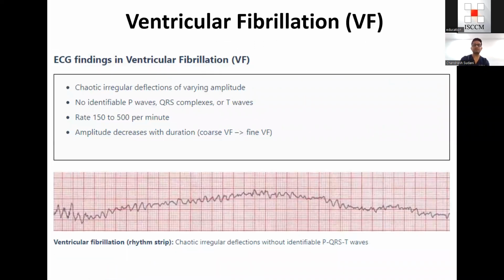Next, this is a very deadly rhythm. This is ventricular fibrillation. A patient who goes into ventricular fibrillation will most of the time be unconscious. They will have loss of cardiac output. Immediate cardiopulmonary resuscitation is really essential.